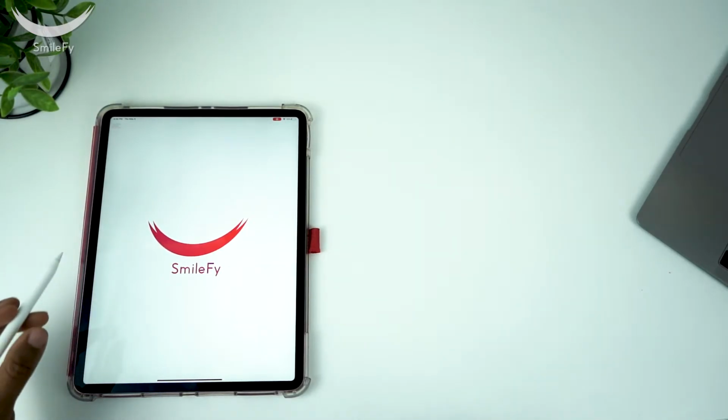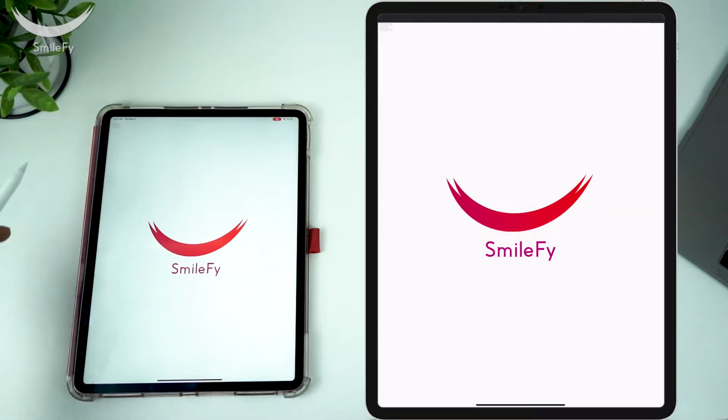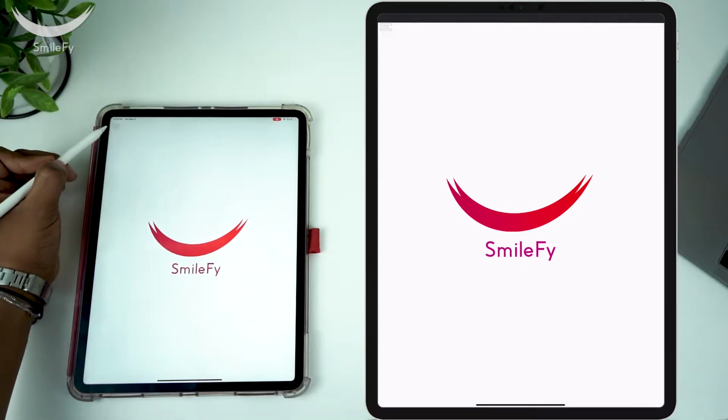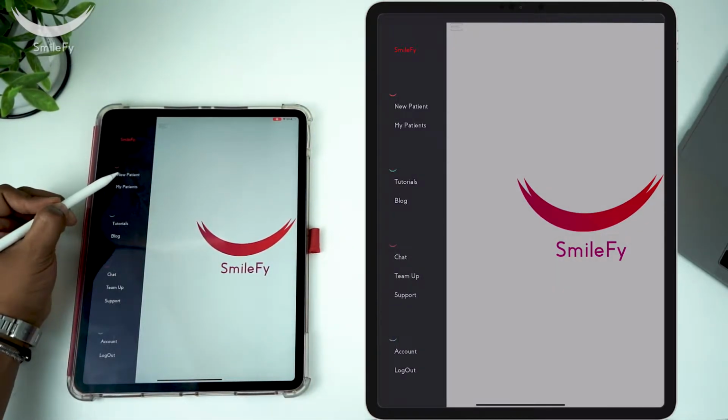To create a digital patient, make sure that you have all of your patient's files in a Dropbox, iCloud, or Google Drive. Let's start by going to the menu. It's on the top left corner, and tap on New Patient.